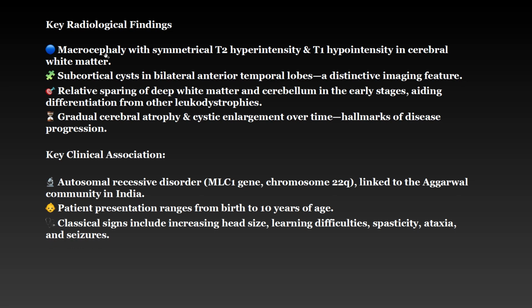Clinically, this patient will present with macrocephaly, and this patient will require serial MRIs as this condition is associated with gradual cerebral atrophy, and the cystic spaces that we saw in the anterior temporal lobe will enlarge over time.